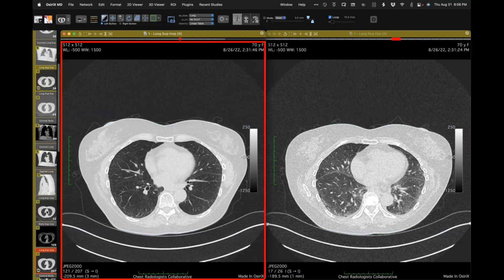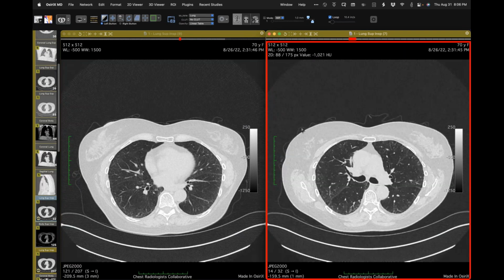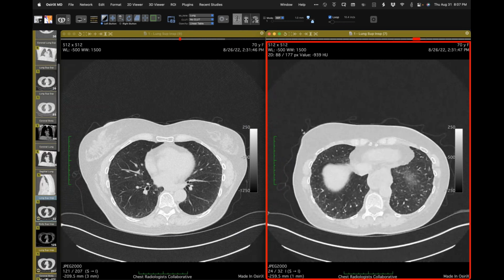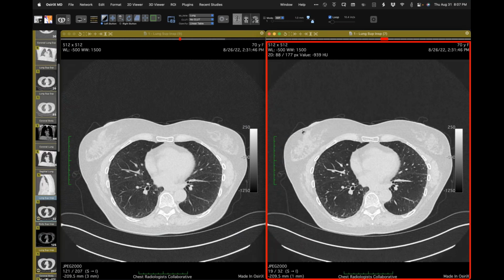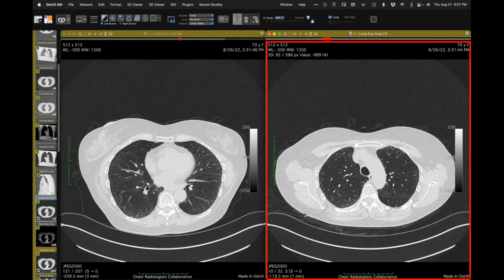They do a limited number of, as you can see here, 32 images of 1 millimeter cuts at substantial intervals. I don't know why they do it that way, but I think most of us would do 1 millimeter section thickness contiguous throughout the lungs with a high spatial resolution algorithm. So let's take a look at these 1 millimeter section thickness images on the right.